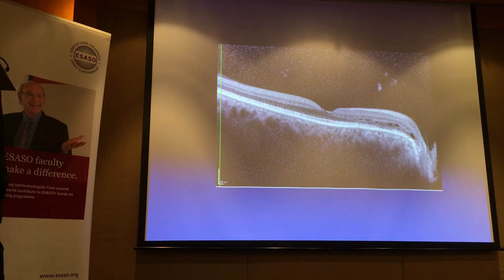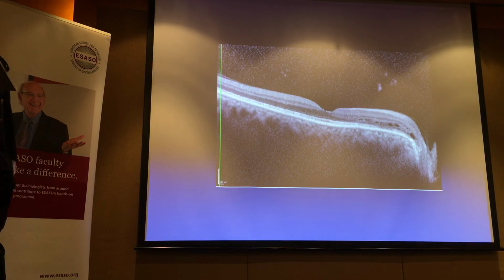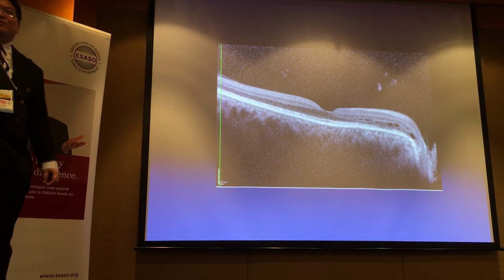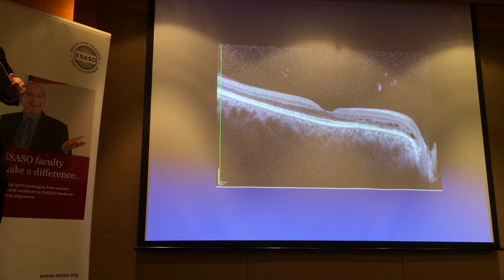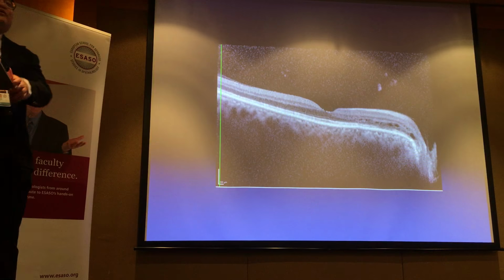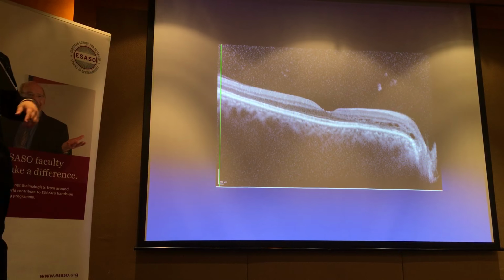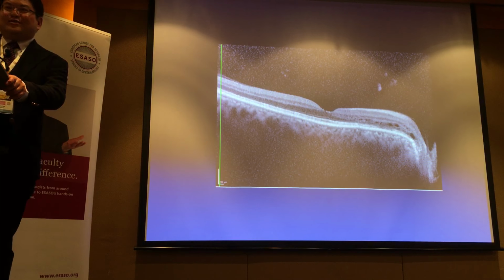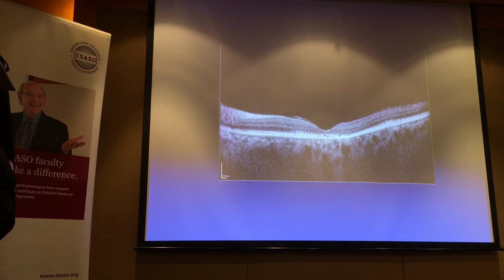And it's sometimes useful to compare with the other eye, because when you compare, then you get a sense. It looks different, doesn't it? In this case, of course, there are some cystic changes here, which is the other question. This patient is coming to my clinic, so I'll let you know the next time we meet what it was. Anyone has any ideas? I'm not sure what it is yet. I have to see the patient; I just glanced at the scan. Anyway, that's the point. Remember that it's not just thickening, it's thinning as well.